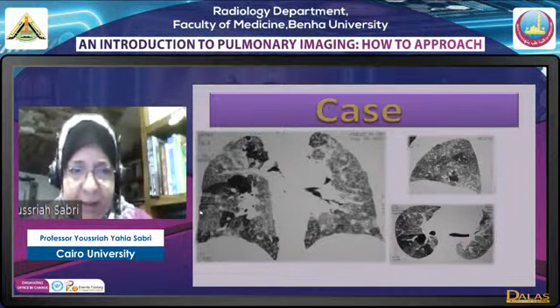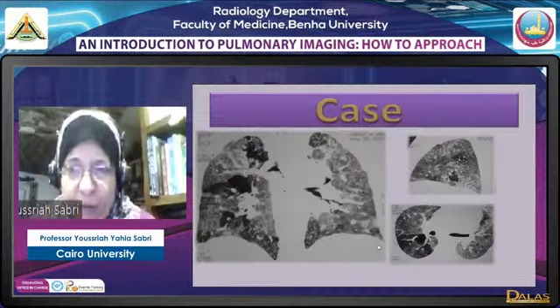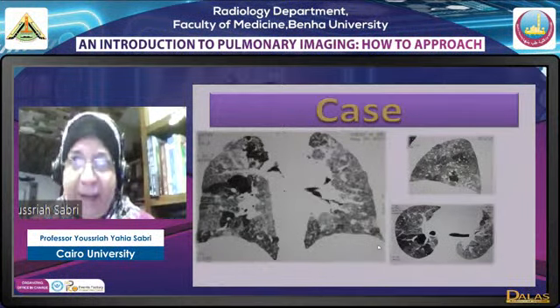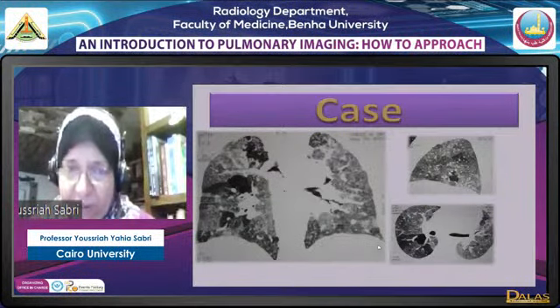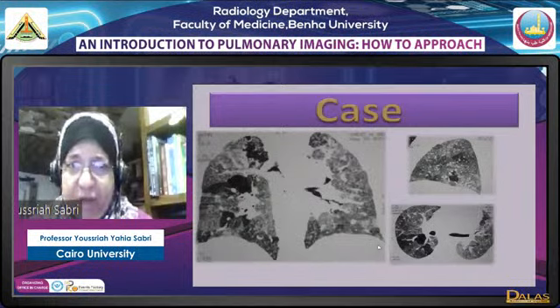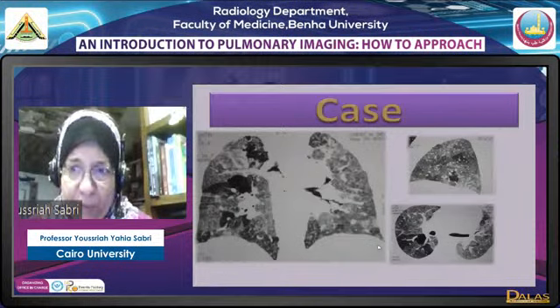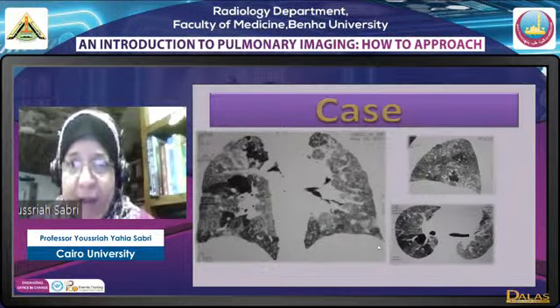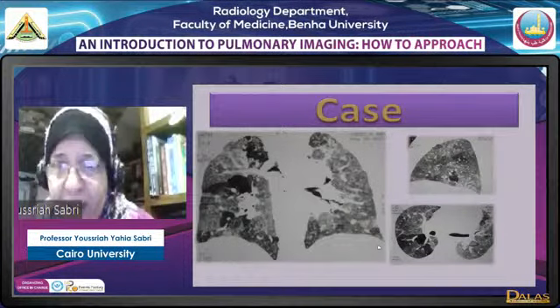With actually, if you look basally, there is relative sparing of the disease. This appearance is pathognomonic of subacute hypersensitivity pneumonitis. So subacute hypersensitivity pneumonitis may appear as bilateral, diffuse, centrilobular ground glass nodules. This is if you see it early. Later on, what we see is actually bilateral mosaic pattern with predominating ground glass opacification, intervening areas of lucencies that represent areas of hypoperfusion or aperfusion and areas of normal lung with relative basal sparing. Subacute hypersensitivity is a radiological diagnosis because clinically it simulates any other interstitial disease.